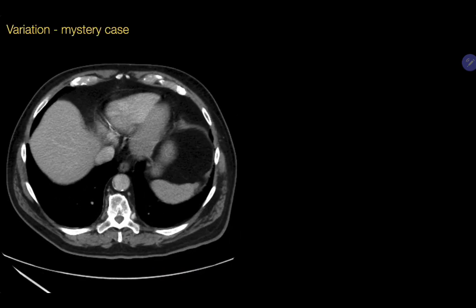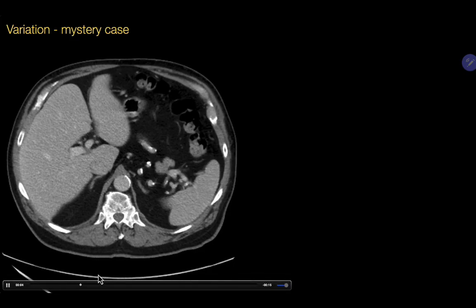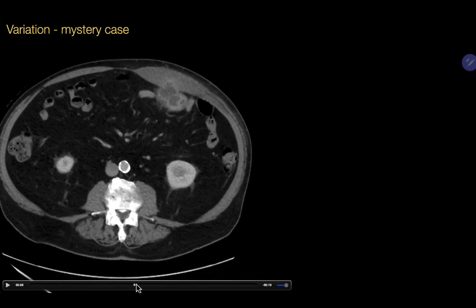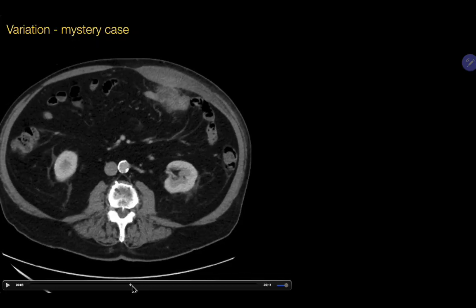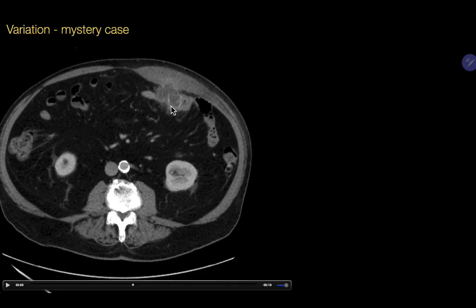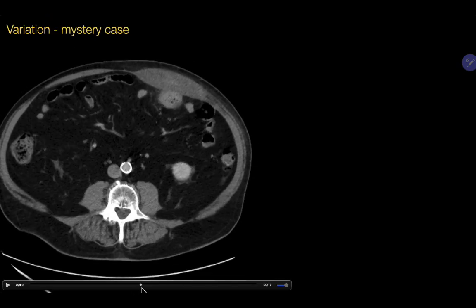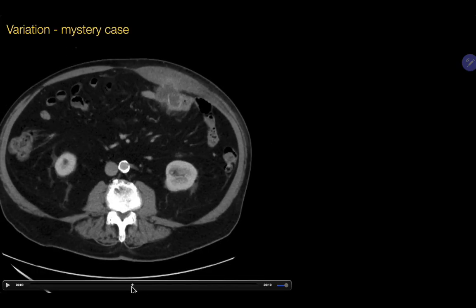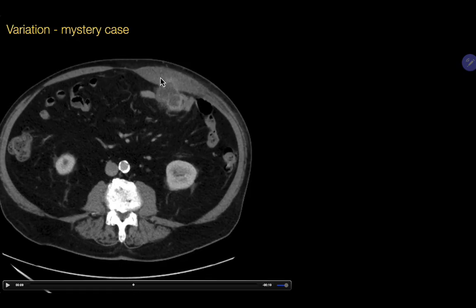Let's wrap up small bowel diverticulitis with an important item to consider on your differential diagnosis. This patient also presented acutely with abdominal pain, has an inflammatory looking collection here in the left abdomen with a linear density within it. There's an association of a thickened small bowel loop and also enlargement and myositis of the rectus abdominis muscle with erosion of that collection into the muscle belly.